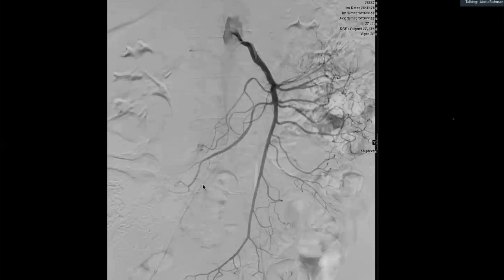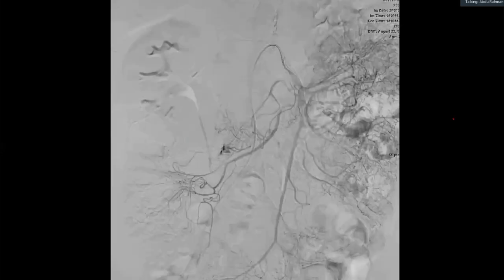I have seen the SMA is most of the time on the right side and the IMA is most of the time on the left side. That's right, but angiograms can be done in different projections, so I wouldn't completely rely on that fact. But remember, where is this artery coming off? This is coming off too high to be the IMA. The IMA you would expect lower down, not all the way up here. So this is an SMA selective angiogram.